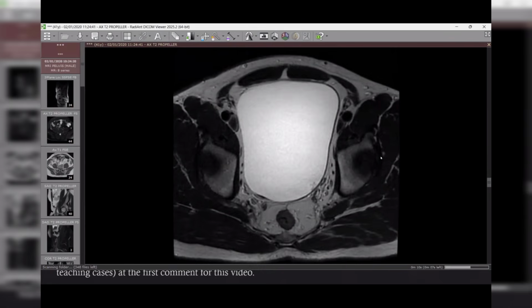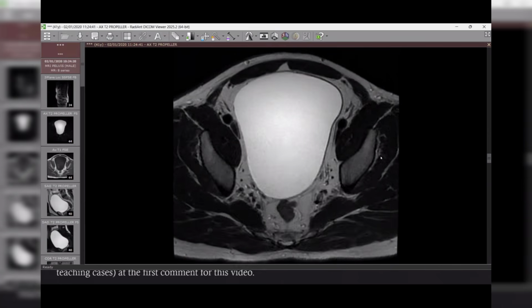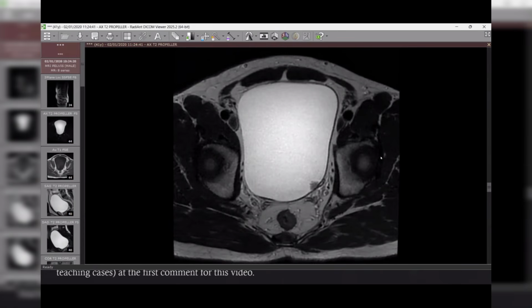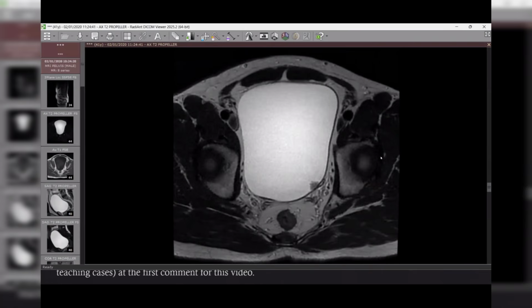Hematuria. In this axial T2 cut of the pelvis, I can appreciate evidence of abnormal hypointense signal in the base of the urinary bladder. It appears related to the trigone on the left, maybe at the left vesicoureteric junction, very close to the ureteric orifice. Is it obstructing or not? No significant obstruction, and it appears to be hypointense.